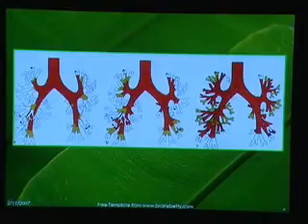What is stained in red will be viewed in virtual bronchoscopy by maximum resolution, and the yellow is at a lower resolution. As you can see, using the 2 mm section with overlap, we can navigate down to the peripheral airways, down to the 6th order bronchial bifurcation.